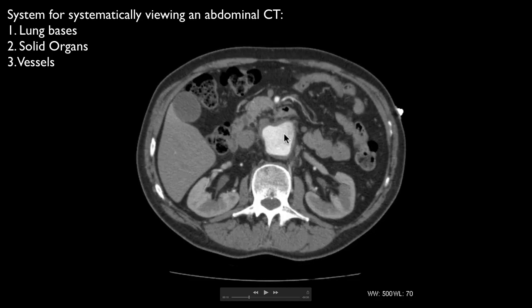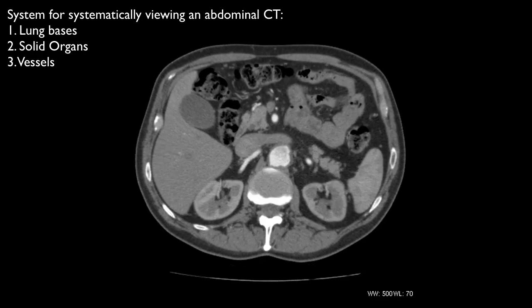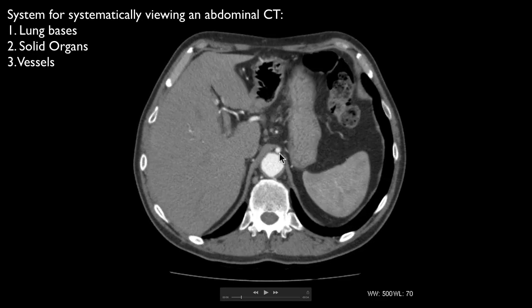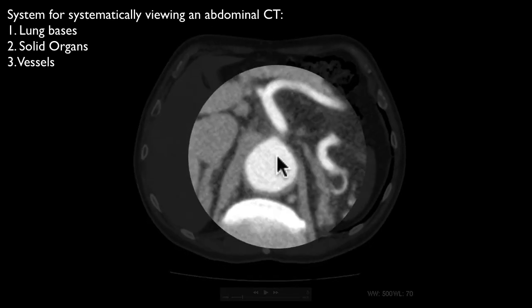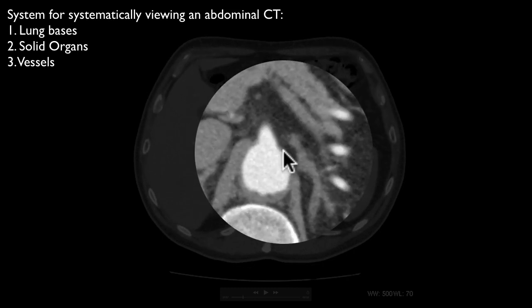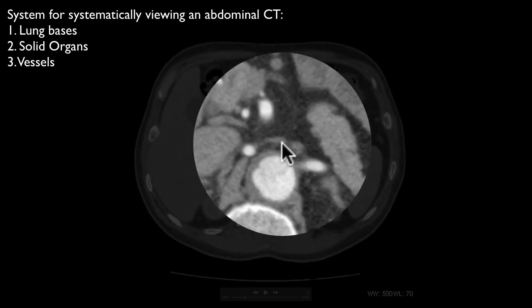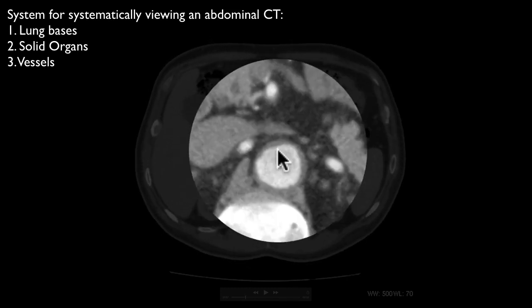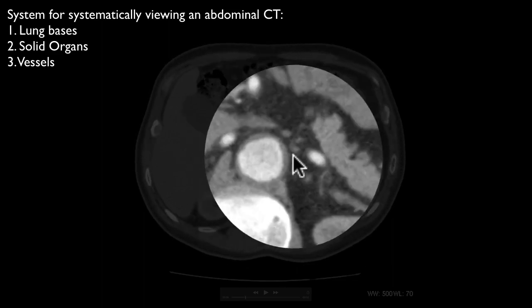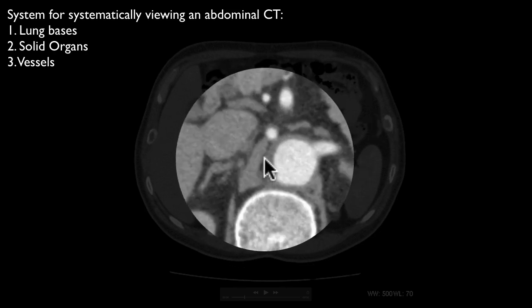So anyway, we're looking at the aorta here because this is a scan done in arterial phase. You can see the major branches coming off here. So that's the celiac axis there. That's the SMA coming off down here. So that's T12, L1: T12 for the celiac axis, L1 for the SMA, and L1-2 where the renal arteries tend to come off. And there's one on the other side. Yeah, that's right. And they are slightly variable in where the renal arteries come off from.